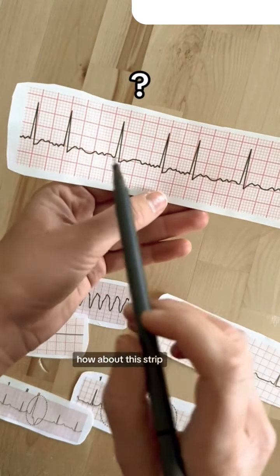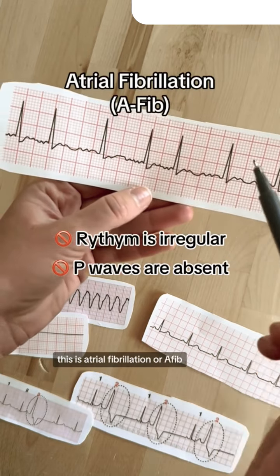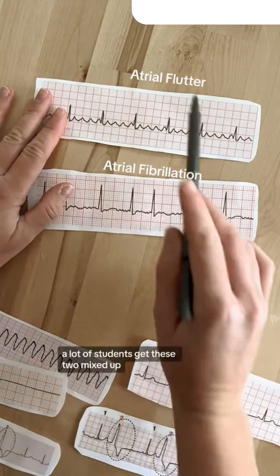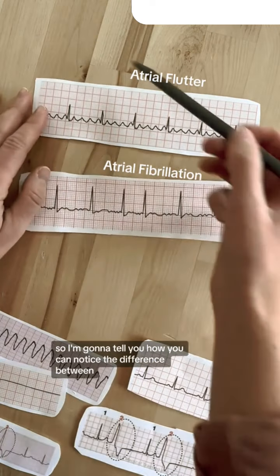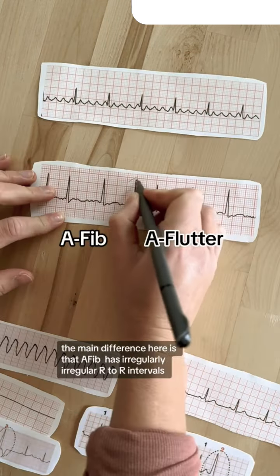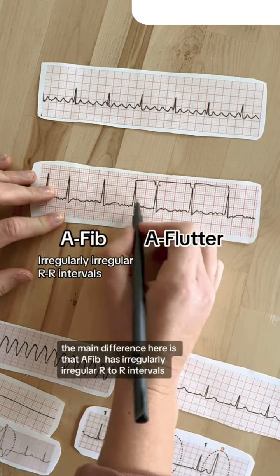How about this strip? The rhythm is irregular and the P waves are absent. This is atrial fibrillation or AFib. A lot of students get these two mixed up, so I'm going to tell you how you can notice the difference between atrial flutter and AFib. The main difference here is that AFib has irregularly irregular R to R intervals.